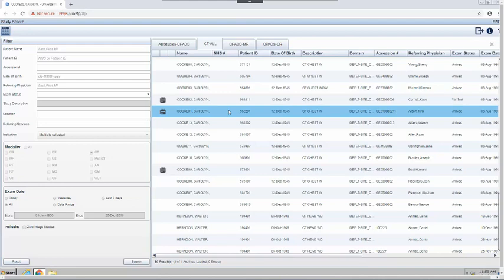Welcome to the Centricity Universal Viewer Zero Footprint Client. In this video, we will discuss displaying an exam from the work list into the viewer. From the search results list, click to open the desired study. The study opens in the viewer.